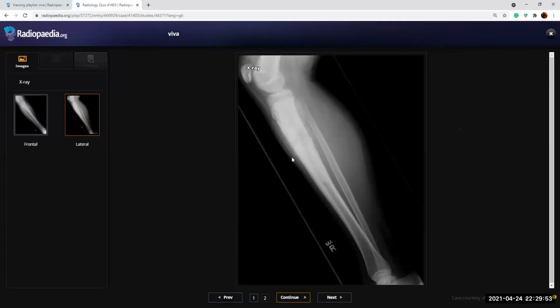So what were the descriptors you used for this lesion? It is diffuse, affecting the shaft and the metaphyseal region. It has osseous matrix of calcification. It has an aggressive periosteal reaction and extraosseous soft tissue components. Okay, what did you mean by diffuse? Diffuse means it's ill-defined, with a wide zone of transition. Yeah, so you would have to specifically mention zone of transition.